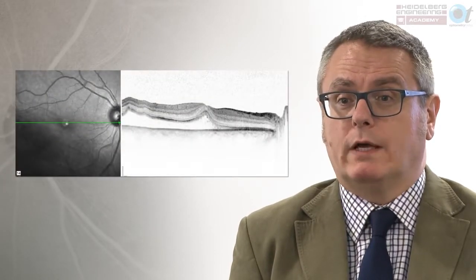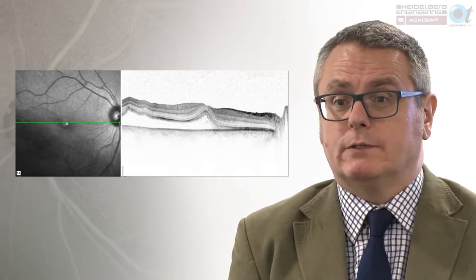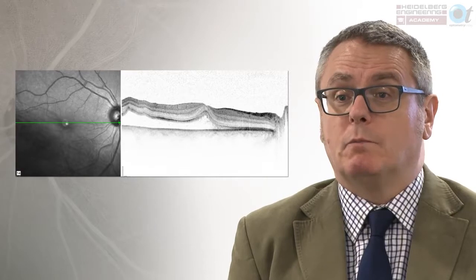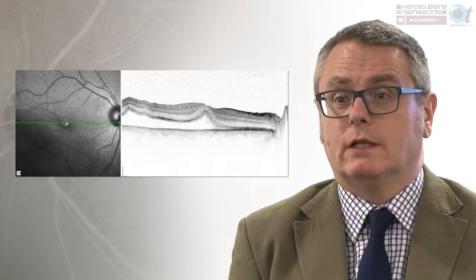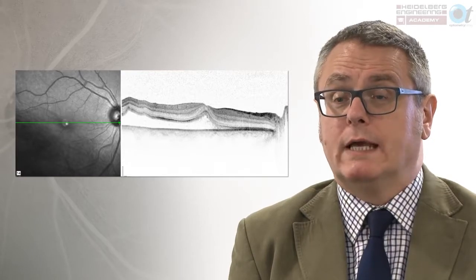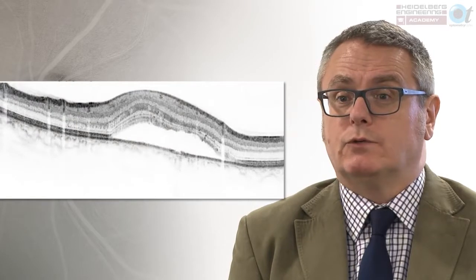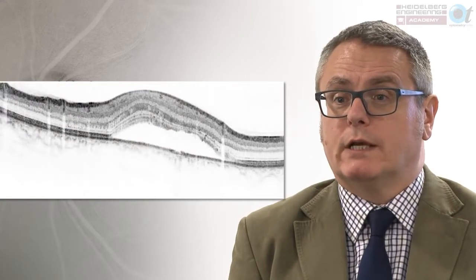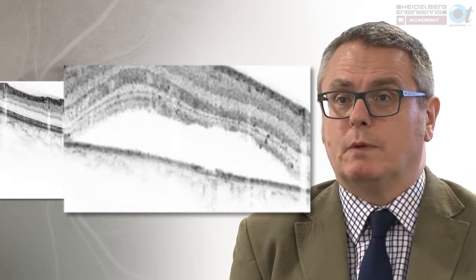We then sought to find in vivo examples where we would see the same changes. This is an image of a patient with a macular off retinal detachment. Again, neurosensory retina has been detached, and the first hyperreflective band from choroid had to be the Bruch's membrane RPE complex. Central serous retinopathy causes a serous retinal detachment, and again in this example, the first hyperreflective band from choroid has to be the Bruch's membrane RPE complex.